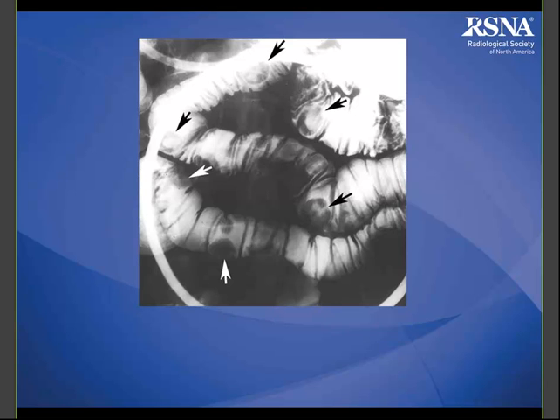A number of intraluminal polypoid lesions are seen on this small bowel follow-through, with the paddle there as well, so compression applied, and we can see that there are multiple intraluminal polypoid filling defects, not causing any obstruction of the adjacent bowel loops. This ended up being metastatic melanoma, but if you saw maybe just a few lesions, you could also include carcinoid in your differential. Obviously, it's very important to know if the patient has a history of a primary tumor to help you with your differential.